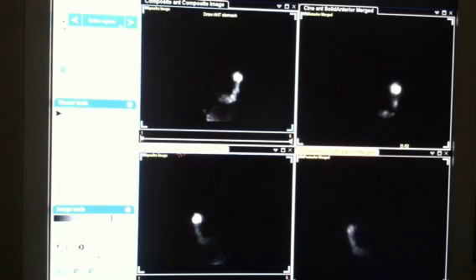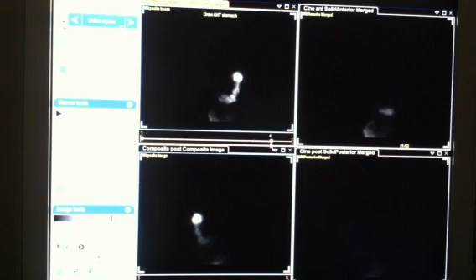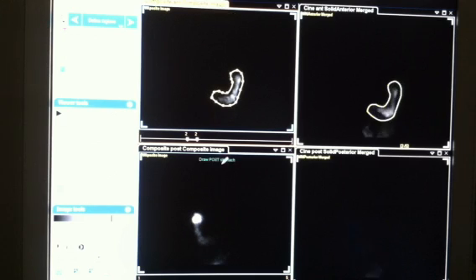Now the first thing we want to do is pick a slice that's a good representation. What you can do is use these slide bars here. This kind of stacks the images together. It looks pretty good already, but I'm going to pick one image that I like. There. Image number 2 usually works. Alright, so I'm going to draw a region of interest around the stomach. Same thing over here. Maybe the same one here.